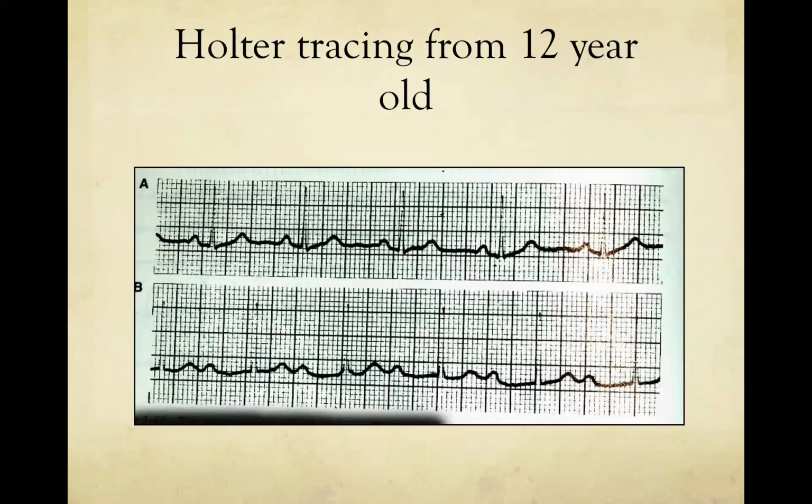I can see it's starting with the QRS, cannot see the P because it's cut out from the tracing. Then I see something which looks like a T wave, and then something which looks like a P wave, and then the QRS complex is there. I don't see the PR. I don't think this is conducting to the QRS complex.